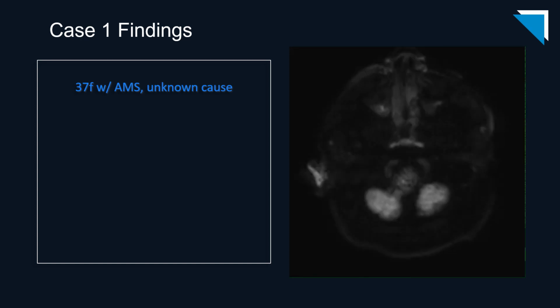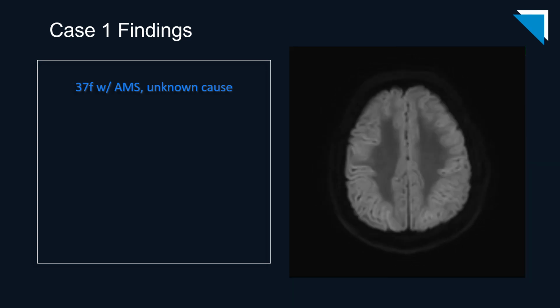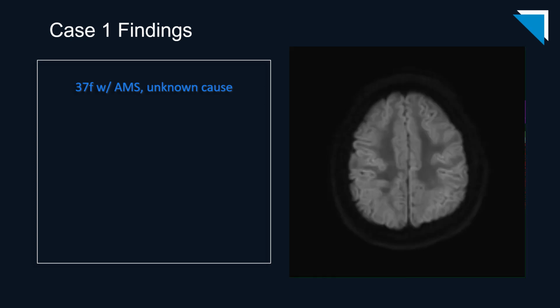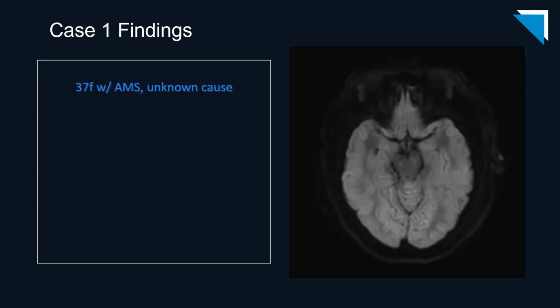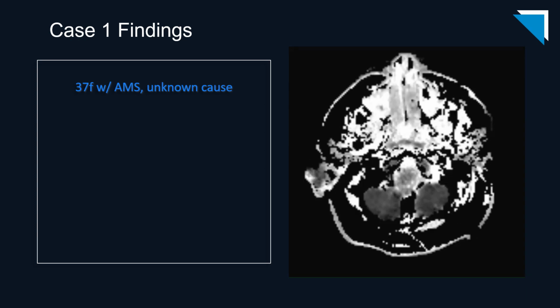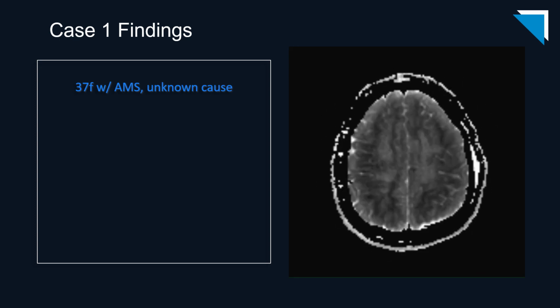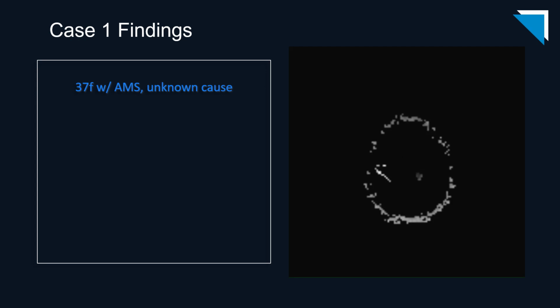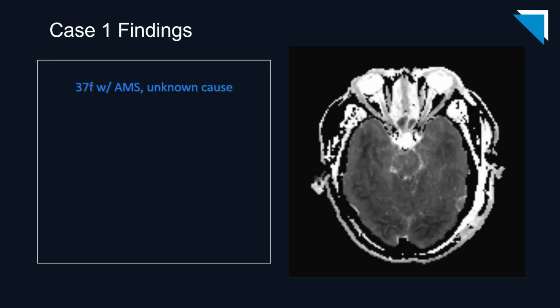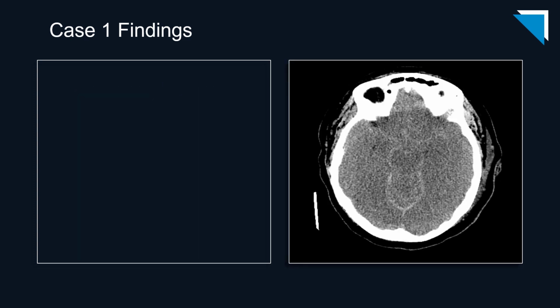The diffusion weighted sequence. And the corresponding ADC map. Let's discuss the findings.